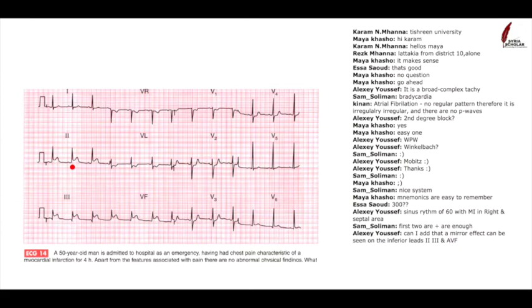But let's go back. You can see some other problems, but the ST segment elevation is the bit that should be telling you where the pathology is. Let's look at this one. This actually shows a nice example of the reciprocal change we're talking about. This person's got chest pain, comes into the emergency department, and you do this ECG trace.